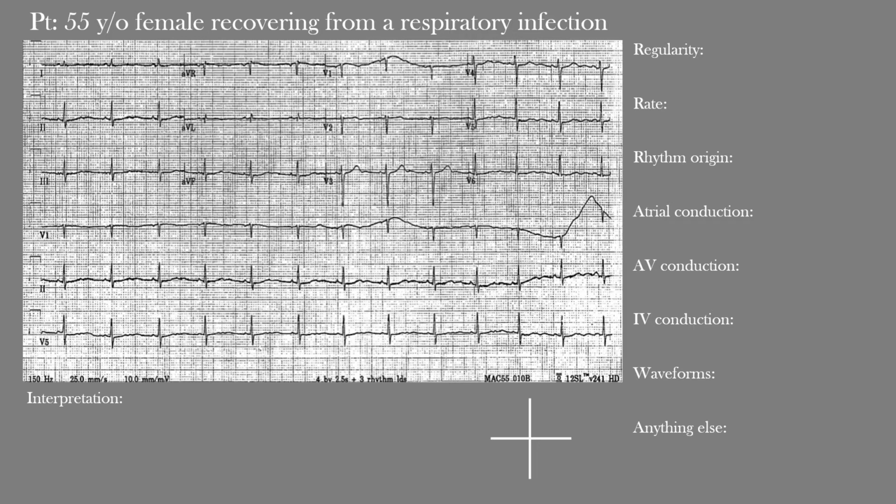This week's case is a 55-year-old female that is recovering from a respiratory infection. She also just finished her last dose of azithromycin and is feeling much better today. Her EKG is shown here.